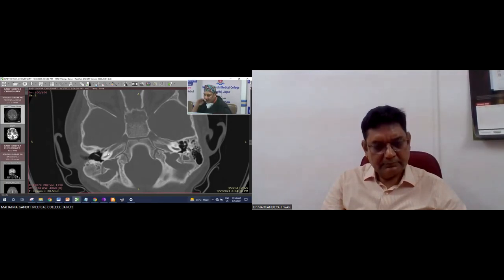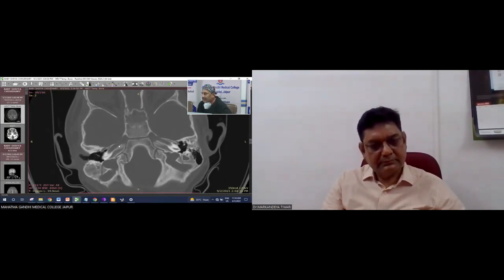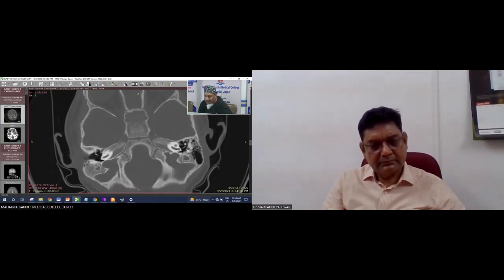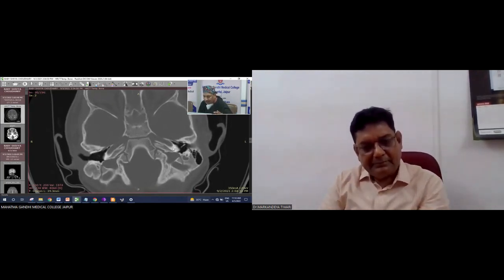Sometimes this bone is deficient, and the literature supports, you will find from literature, some of the people have accidentally implanted the cochlear implant going from here directly into the carotid canal. Can be a disaster if you are unaware of it, or if it happens to damage, or while removing it, pulling it back and tear the carotid artery. All those are different aspects. We need to be very careful. So this cochlear carotid partition we must look at before every cochlear implant to see if any disaster can happen.